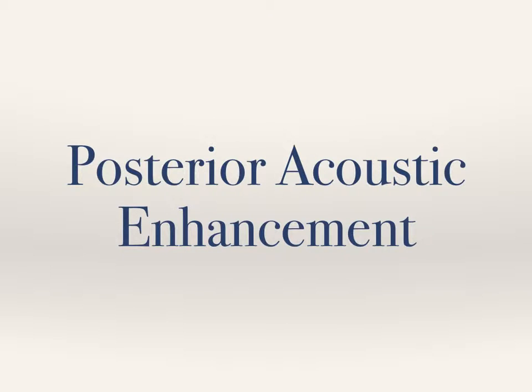Posterior acoustic enhancement is an artifact that can be seen with some abscesses. If sound travels through a medium or tissue that doesn't absorb or reflect as much sound energy, more of that energy can be transmitted beyond that tissue to the tissue that is found deeper or behind it. In doing so, the tissue behind or deeper can appear brighter than other tissue at that same level. This is often seen when imaging through fluid-filled structures, of which an abscess can be included in that category.